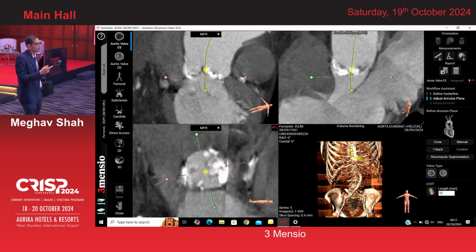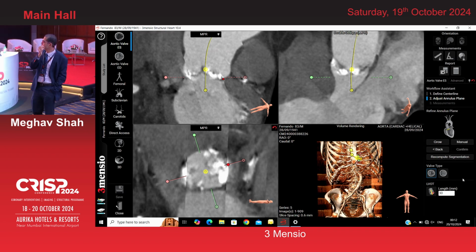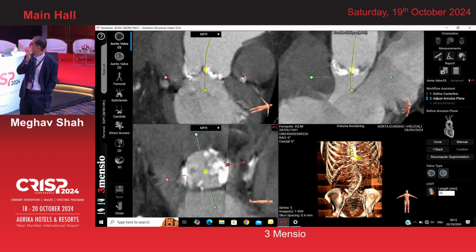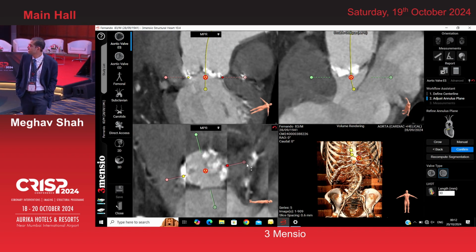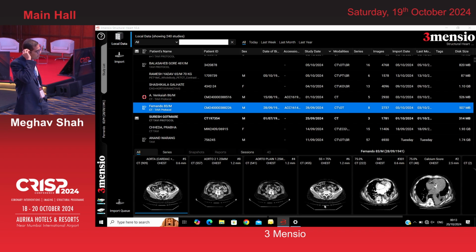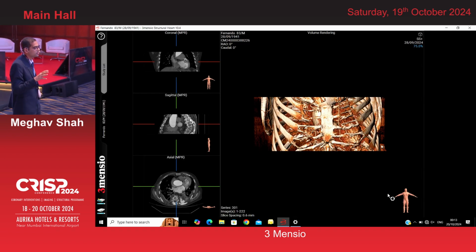And it's even more difficult when you have these patients in the cath lab and get the coplanar view on the angio. So while Gaurav is doing the annular plane measurements, getting the annular plane, what I'd like to specify is that it's not just the measurements, you have to see how calcific the valve is. And it's not just the calcium score which is important, or where the calcium is. It's also the morphology of the calcium that's very important.